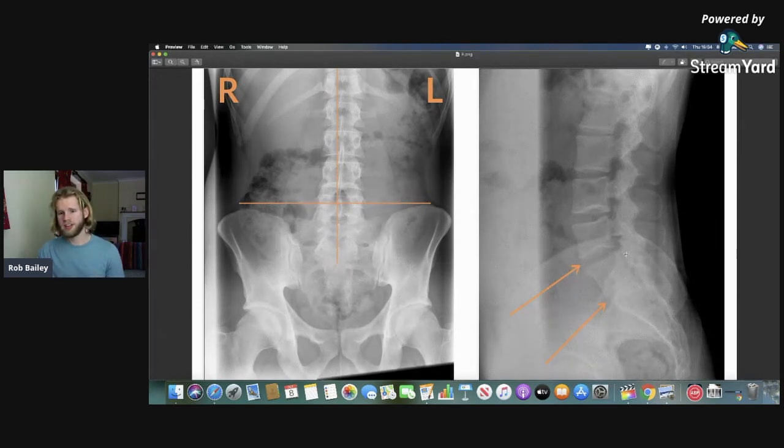When we look over on this side here, the first thing you notice is actually that my spine is very, very straight. So my tummy is there, and then all the muscles run down the back there. Yeah, my spine is actually quite straight through there. So we've got number 5 here, number 4, number 3, number 2, number 1. Now, first off, what we'll look at is the fact that these spaces where the discs are, they get progressively bigger down to here. I don't know if you can see that there.